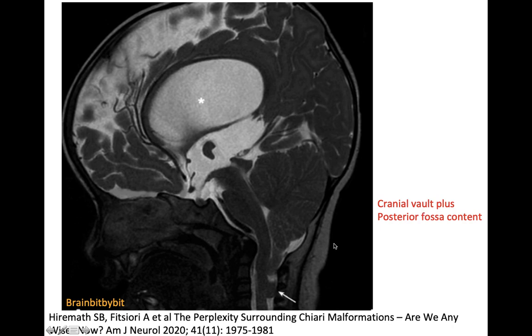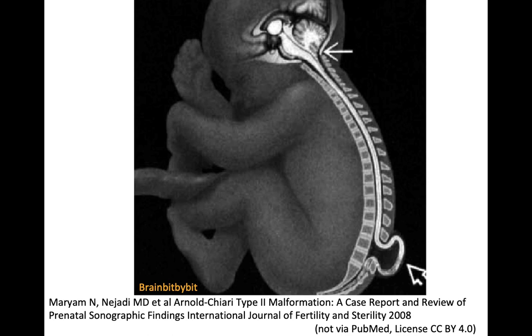And in the Chiari II malformation or Arnold-Chiari malformation, there is a towered cerebellum with tonsillar herniation, often a beaked tectum, and supratentorial hydrocephalus. And Chiari II malformation is almost always associated with a spinal dysraphism. And the concept is that the leakage of CSF in the lumbar region prevents normal pressure and expansion of the posterior fossa.